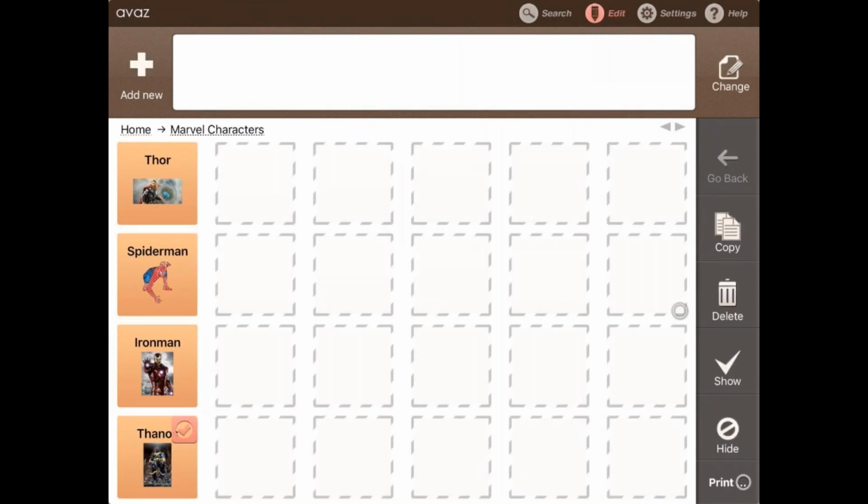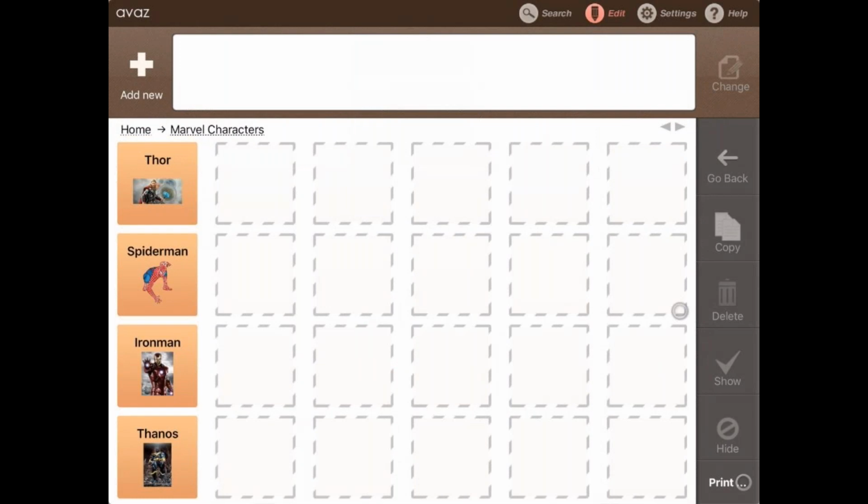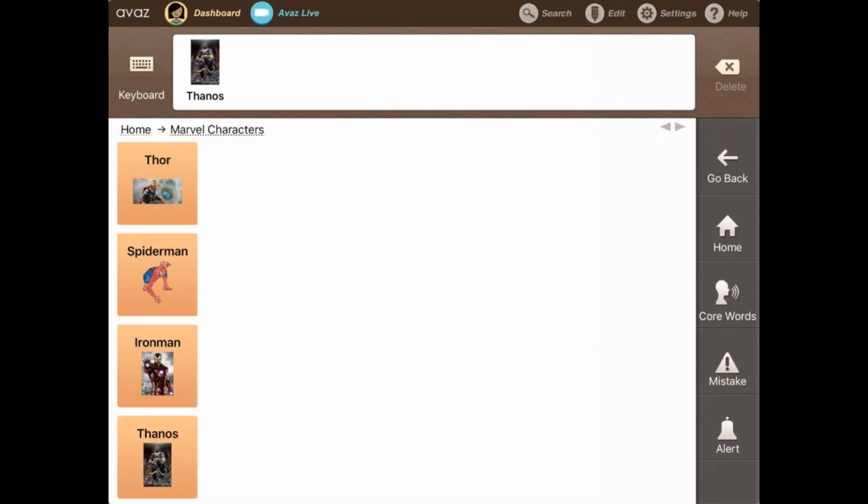I'll click on change, delete the word, and now I am able to record my own voice for this message and say Thanos. I will save it, exit, and say Thanos. So now I have my own voice for the word Thanos, and that is how I can add my own custom voices for each of these words.